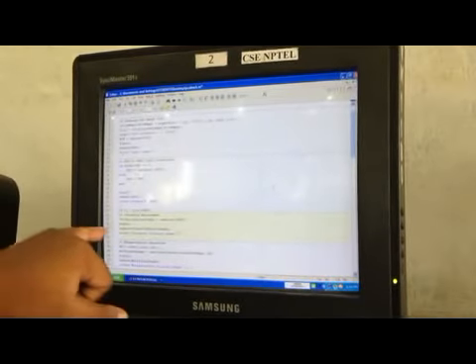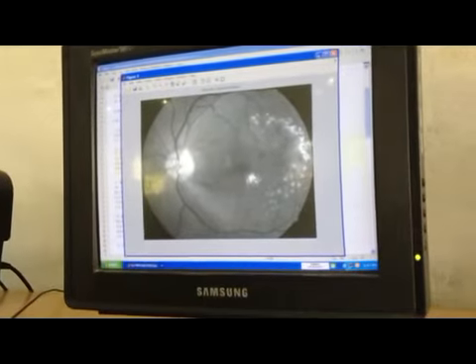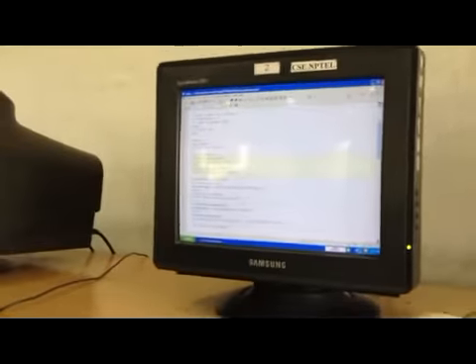And the syntax imadjust will display the adjusted intensity image, and imshow will be used for displaying the adjusted image. And this is the output for the intensity adjusted image, and then we are going to process for the morphological operations.